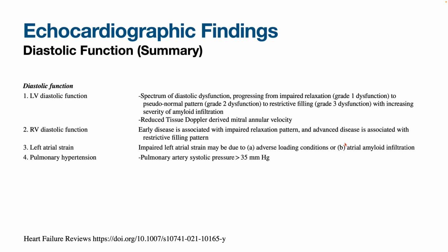So in summary, in LV diastolic function, the spectrum of diastolic dysfunction will progress from impaired relaxation, grade 1, to pseudonormal, to restrictive filling pattern with increasing severity of amyloid infiltration. That was one of the first papers that Dr. Klein did in the early part of echo history.